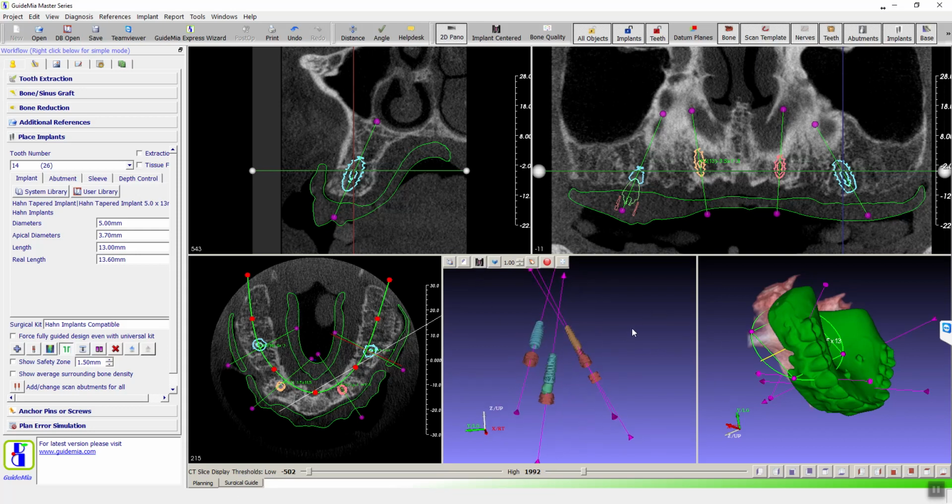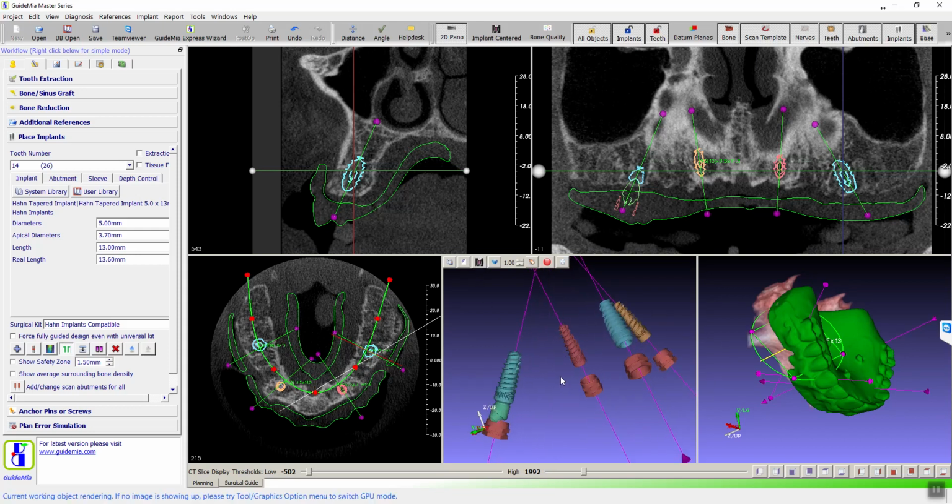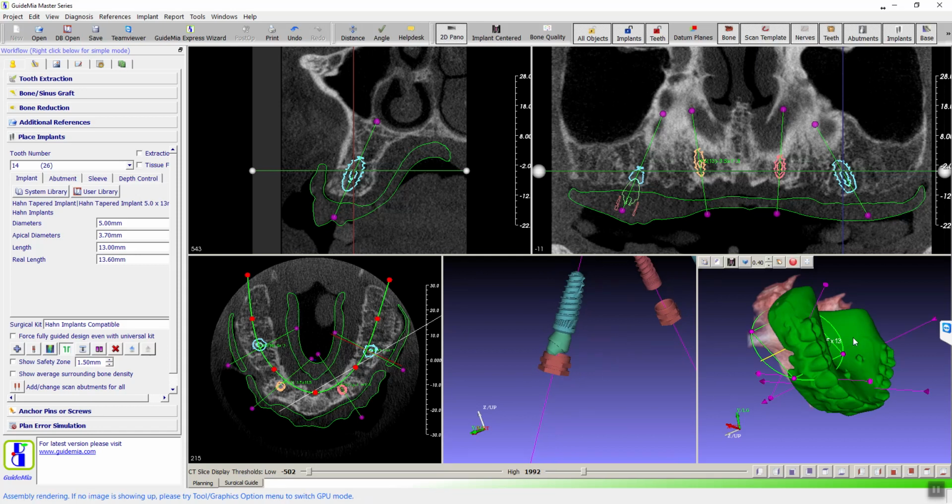Let me turn off this. So you can see from here. Brian, last time you suggested we have the longer shaft. I don't quite remember if I got it already. No, IT designed, or Grant designed them for me, and I just installed them on mine. I'll make sure to send you a copy of them.